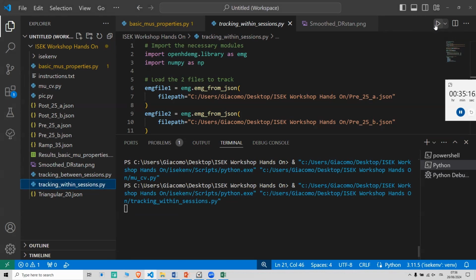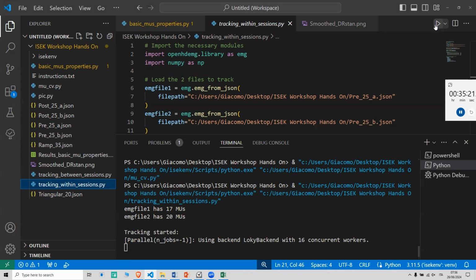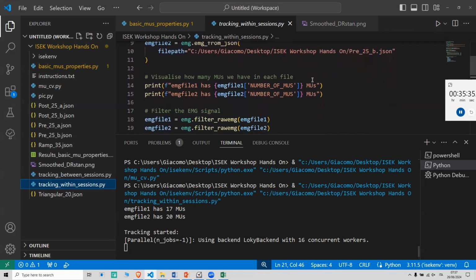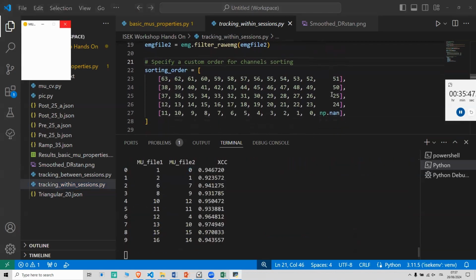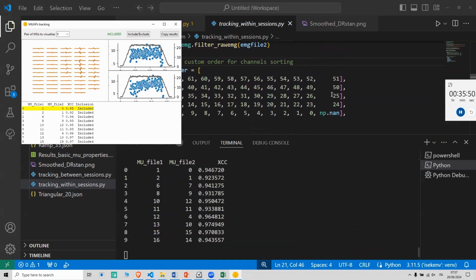Well, the guys have implemented this code that we, of course, showed in Journal of Physiology in 2017. Again in openhdemg. So here at the beginning of the code, you can see how the functions and the files later on are imported. And again, I mentioned that there was some overlap with what Andrea was showing. Then you perform some filtering on the EMG signals, and then you arrange the electrogrid at the end, okay?